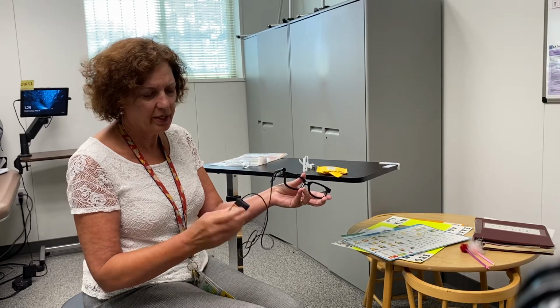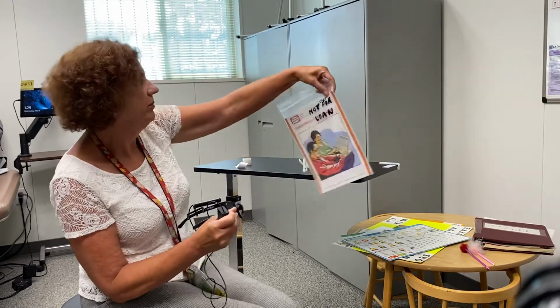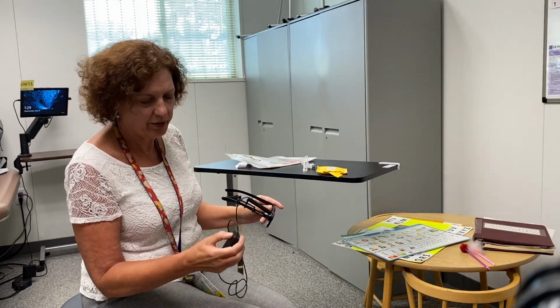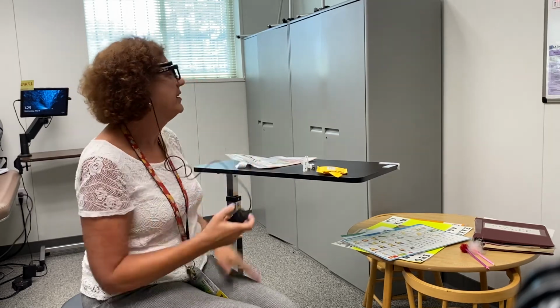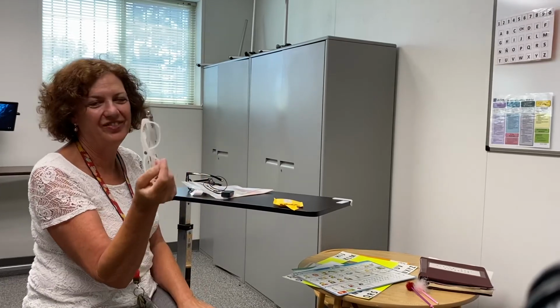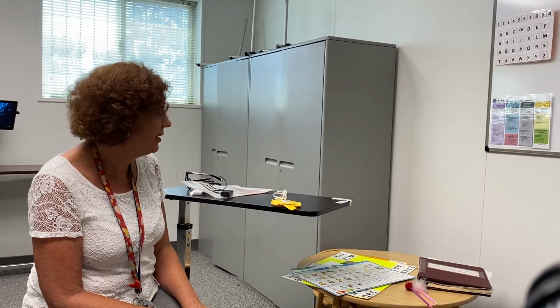This is even called Low Tech Solutions. Laser pointer from Low Tech Solutions. It does have the ability to have a little switch on and off, and it's attached to these glasses, and it's the same thing. $100 versus, gosh, sorry, $100 versus $5 plus the glasses. So just a nice quick thing to make for low tech.